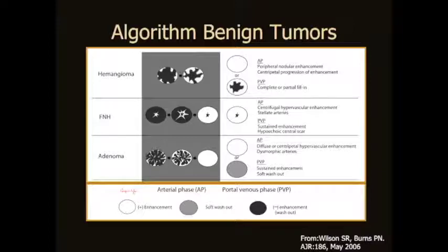And of course, with imaging of adenomas on both CT, MR, and on CEUS, we're familiar with the fact that a good proportion of these lesions will show weak washout. But nonetheless, the fact that these lesions have this specific arterial phase features and this tendency to sustained enhancement really helps us to be exceptionally accurate for characterizing these benign lesions.